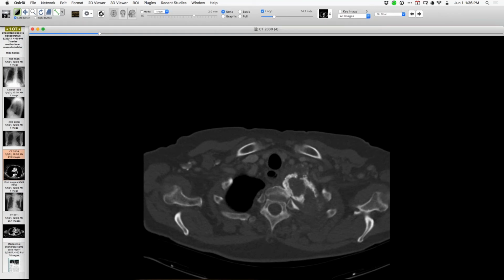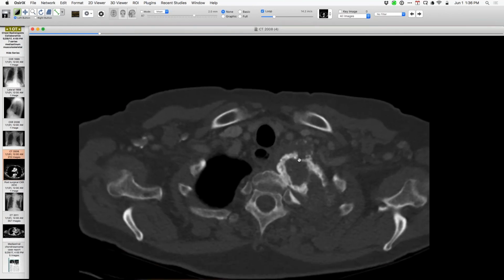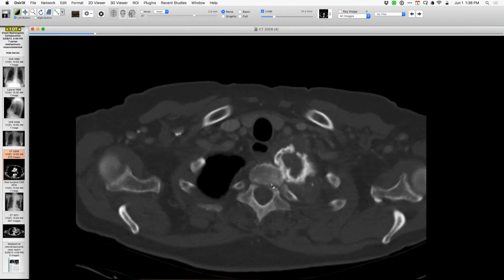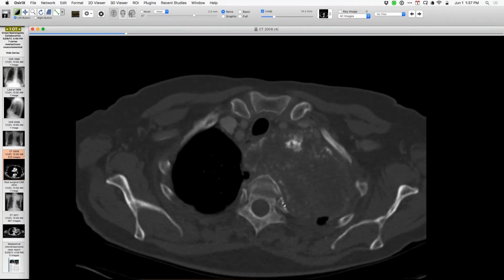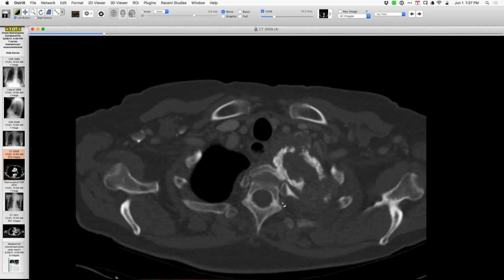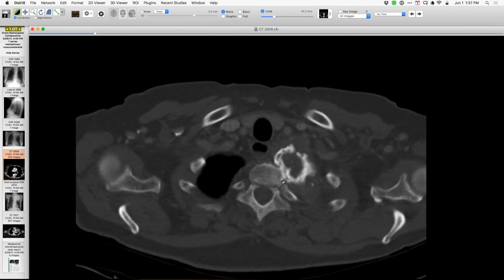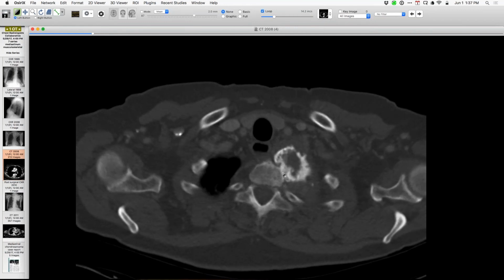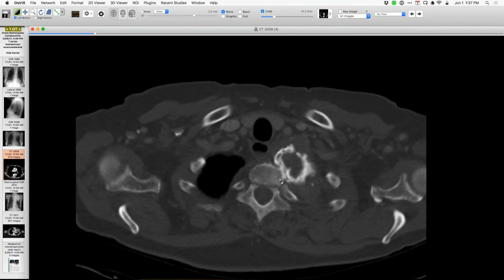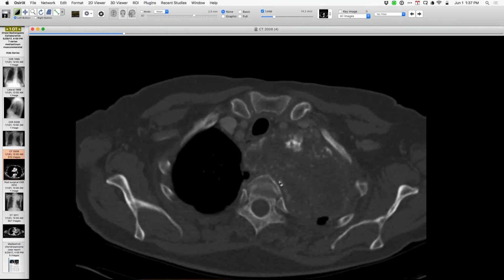I don't know if any of you think that one can conclusively say with confidence that it's clearly arising from this vertebral body for sure, because this is a chondrosarcoma of mediastinum, and that's certainly been reported. I can see the contiguity there. I don't know if it's actually arising there or not, but it's certainly hard to separate out in that particular location. But a debulking was attempted, as you might imagine, that wasn't entirely successful.